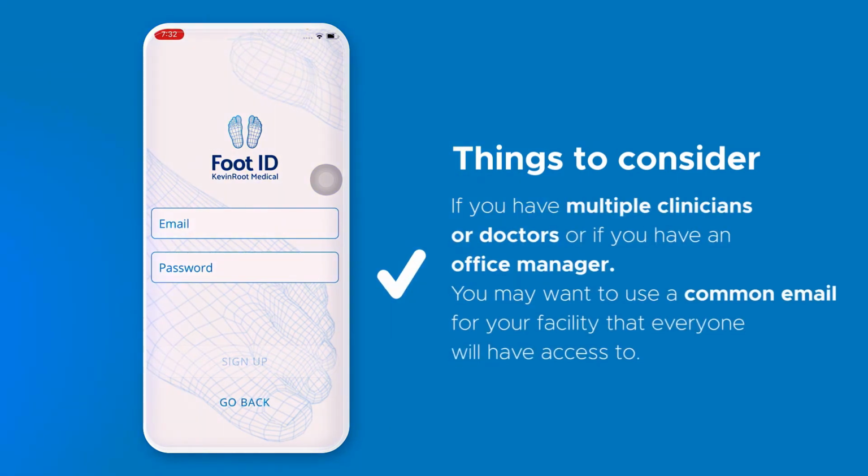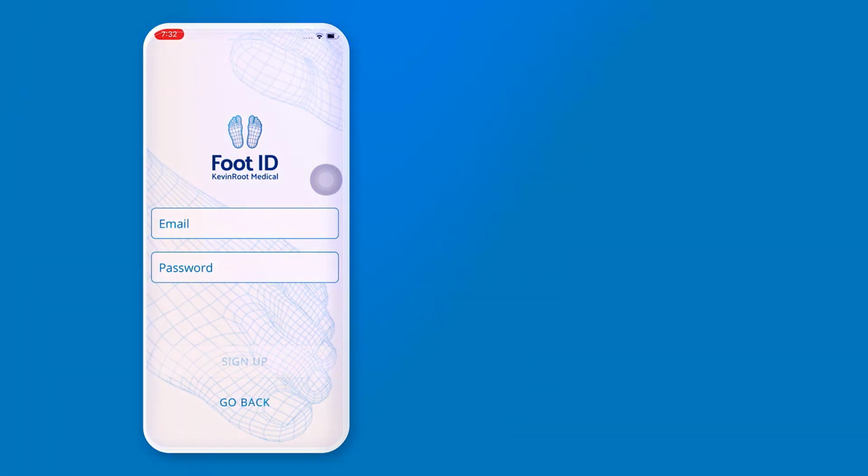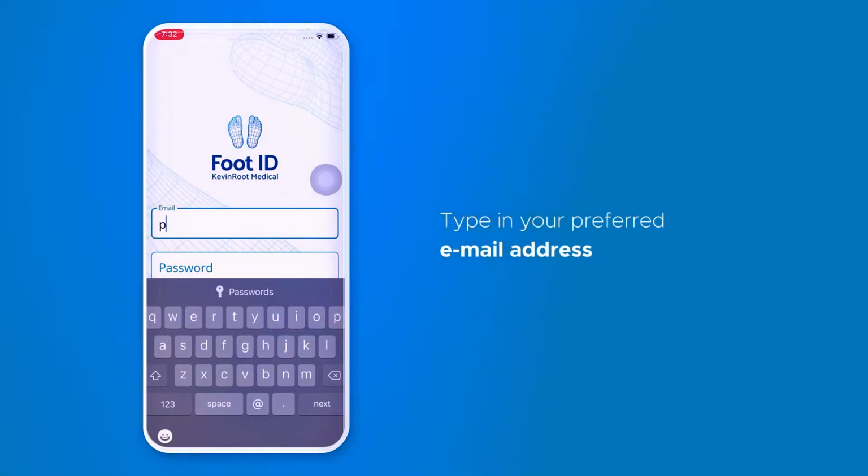Also, if you have multiple clinicians or doctors, or if you have an office manager that will need access to the account in order to save or submit orders, you may want to use a back office or common email for your facility that everyone will have access to. I'm going to go ahead and select an alternate email because my work email has already been used.